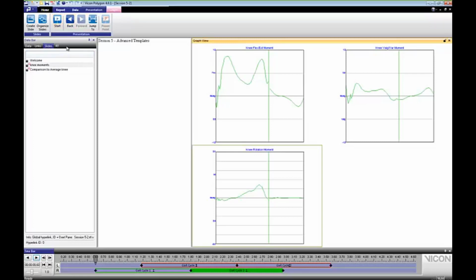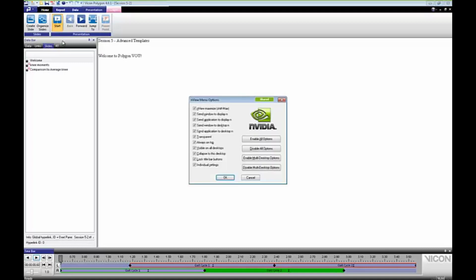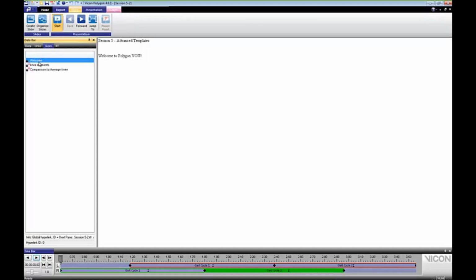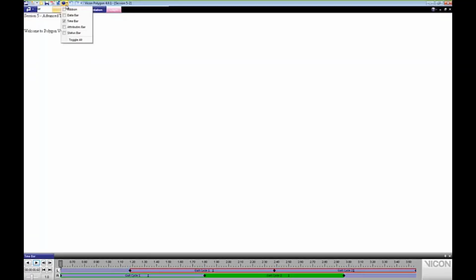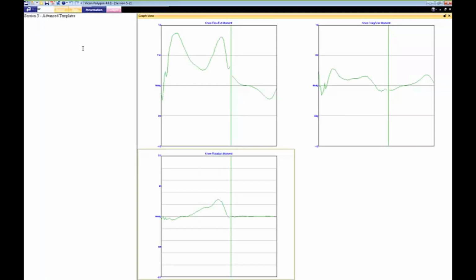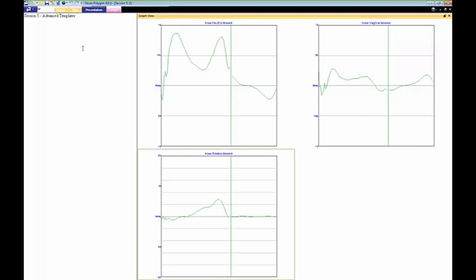I'm actually going to turn my toolbars off the long way so I don't accidentally disrupt the call. But you guys will be able to use F5, and then F4 to go forward, and F3 to go backward.